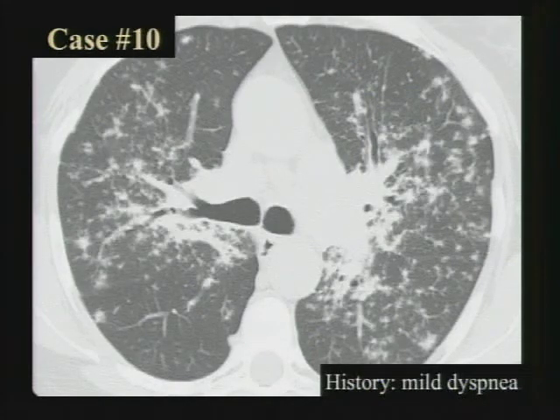We're running through these. Really a radiology classic. Nodules, what's the distribution? You have three choices: random, perilymphatic, centrilobular. Looks real patchy. When it's real patchy like this, it's really unusual for random disease to give you that, because random disease typically is hematogenous spread of infection. Notice there are subpleural nodules present. That essentially excludes centrilobular disease.